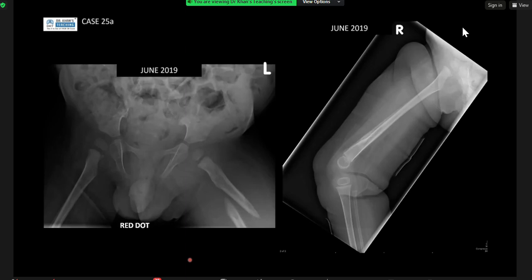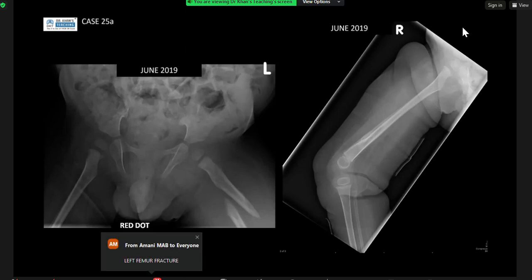This is a frontal radiograph, probably a view of the pelvis. I can see that there is an irregular lucent area in the right femoral neck, intertrochanteric region and proximal shaft. There is suggestion of some moth-eaten appearance, suggestive of an aggressive pattern. There is no pathological break. There is no extraosseous soft tissue. So this could represent Ewing sarcoma or lymphoma.